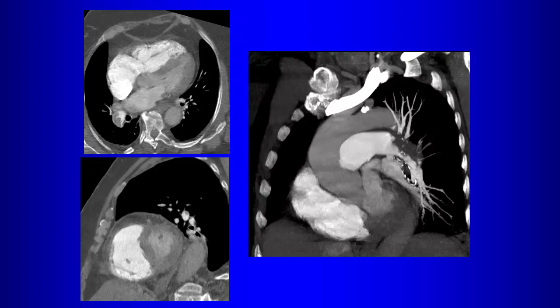So there's a need for numbers like that. But when you're doing them and you see all kinds of cases coming through the ER, you have to use your judgment as to how well you can evaluate the pulmonary arteries. At what point do I say, all right, there's no large central PE, but I can't tell you anything about the interlobars, the segmentals, or the subsegmentals. That's really what you need to determine.